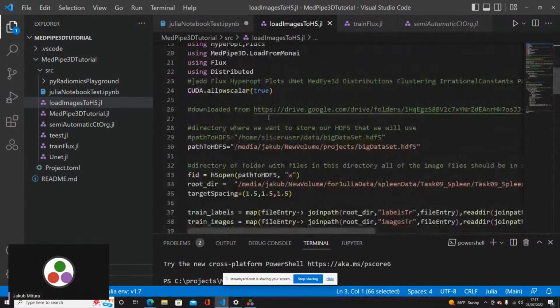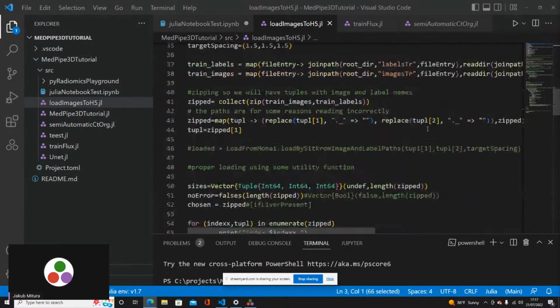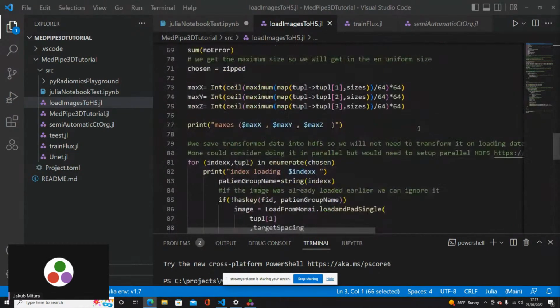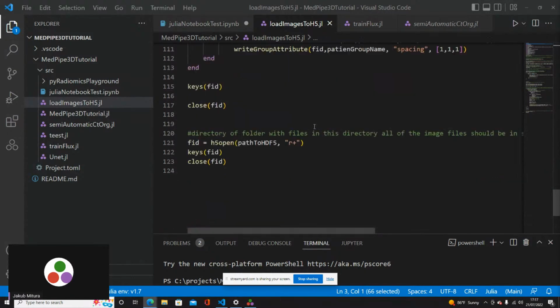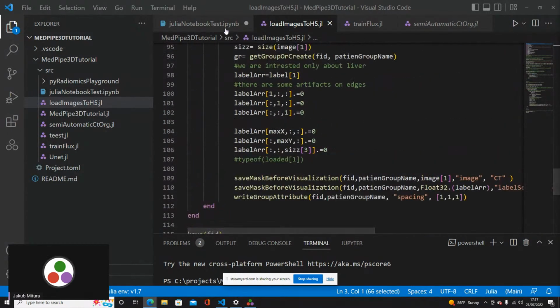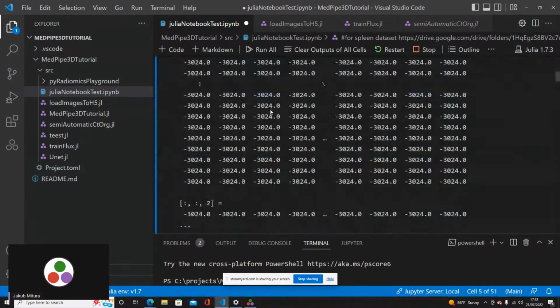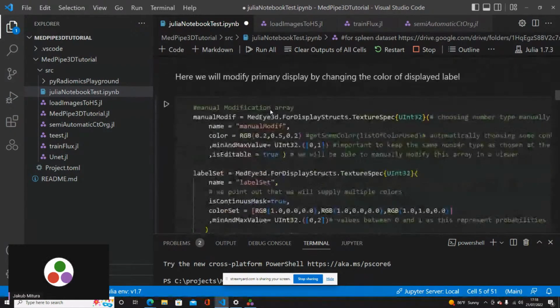If you would rebuild it, it should work. I hope it will help you. You can also try this MONAI. Basically, I'm working to get rid of the Python dependencies, but this is work in progress. But if you still have some problems, you can just reload the dependency, the data, and I hope it will go well now.